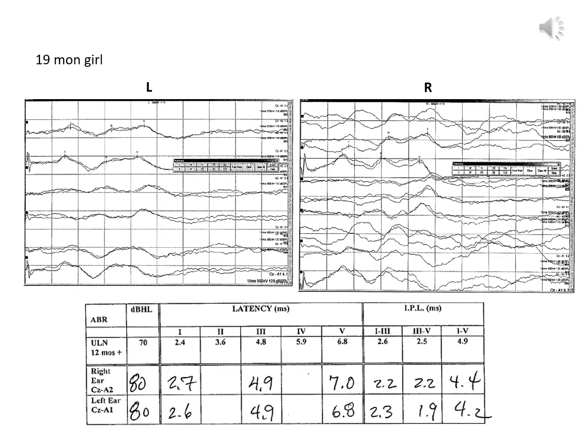This is a brainstem auditory evoked potential in a 19-month-old girl. In the left panel, you'll see 6 tracings, and in the right panel, there are 9. And so the numbers aren't there, but what it means is that in the left panel, these were recorded at 70 and 80 decibel, and then on the right ear panel, it's recorded at 70, 80, and 90 decibels.